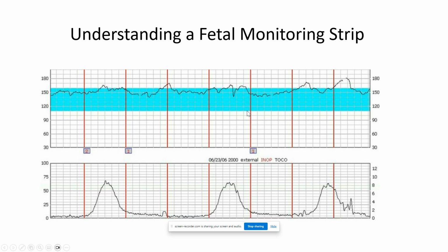And this is important because when we are talking about a non-stress test, an NST, we are looking for two accelerations in a 20-minute strip. And we'll discuss that a little bit as we go on. But that is what we're looking for. We love accelerations. Accelerations tell us that our baby is happy, well oxygenated, and that our baby is thriving.